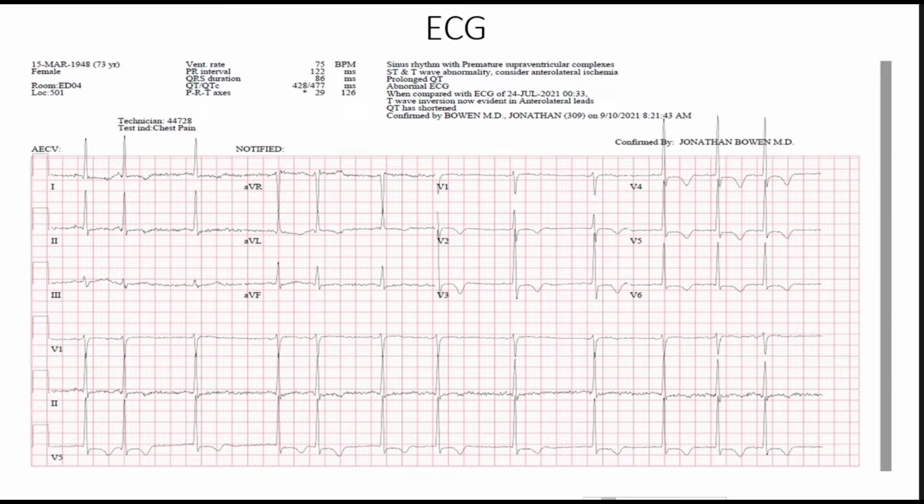To your point, this EKG, with these T-wave abnormalities and the fact that it doesn't meet the criteria, is very consistent with apical hypertrophy. This is the type of EKG you will see. That was kind of where I was leaning. I'm rusty on my EKGs, but that was kind of what it was starting to tell me. I'm glad that kind of panned out.